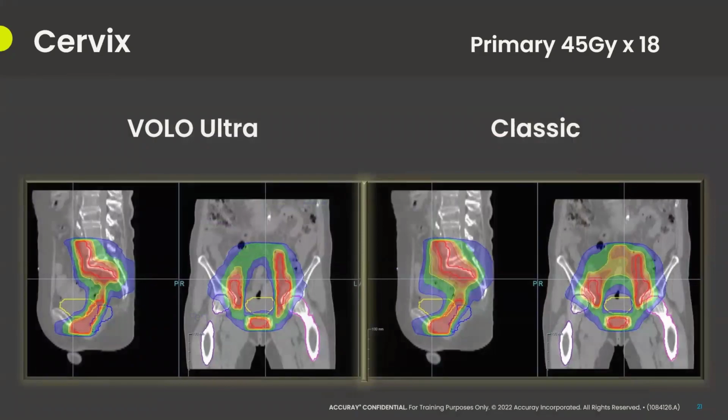Looking at the dose in these orientations, note the dose reduction in the coronal area where the PTVs are transitioning into a smaller size. This also gives you a nice view from the sagittal orientation where the dose conforms better through that sacral area on both the anterior and posterior areas.